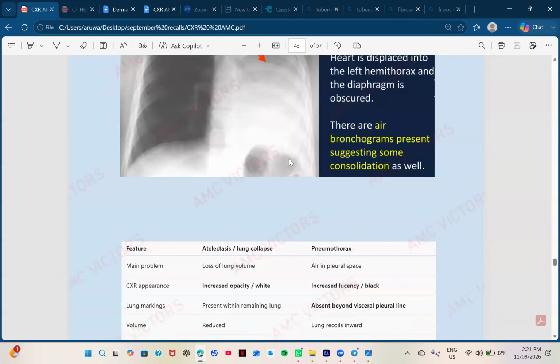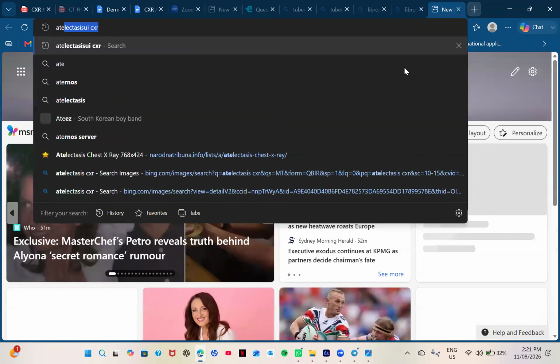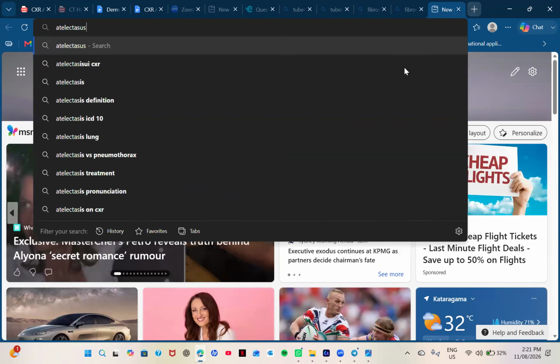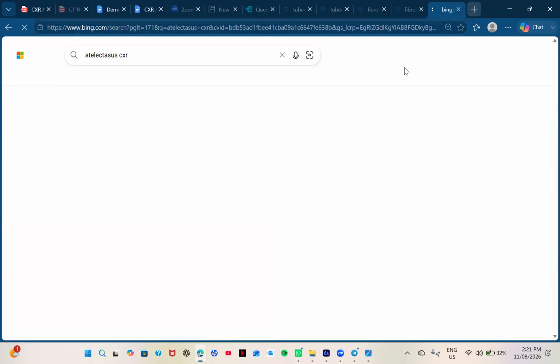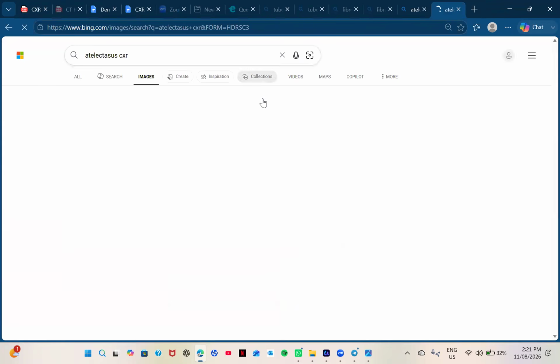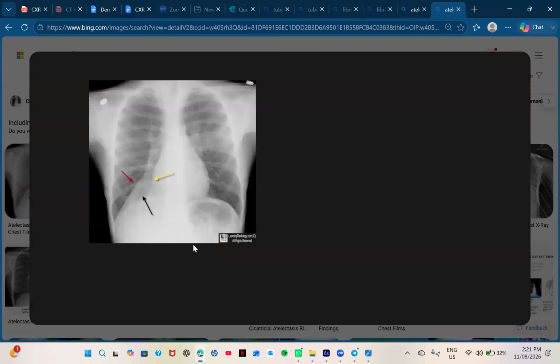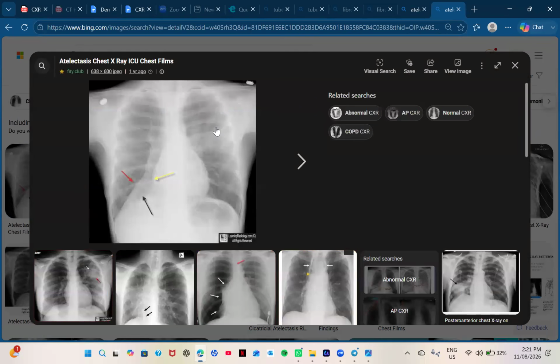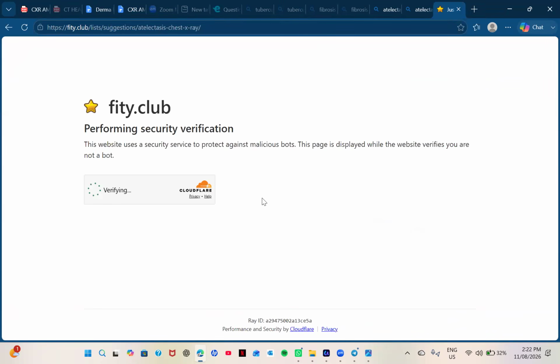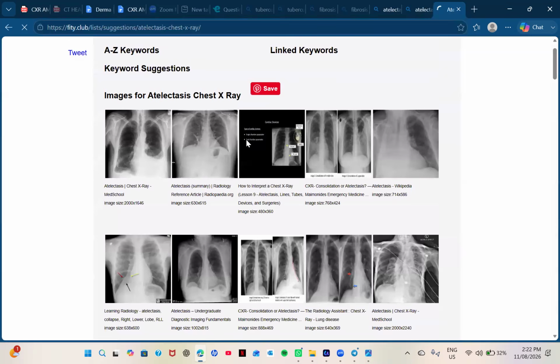Okay, here doctor, I will try to find a better one. This one is not better. I need to show it very clearly with the letters. Some pictures are very hard to find.